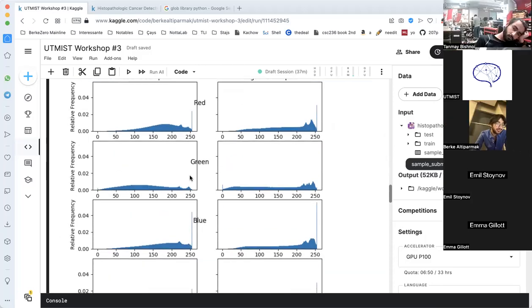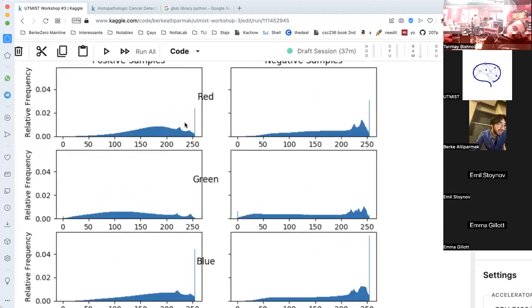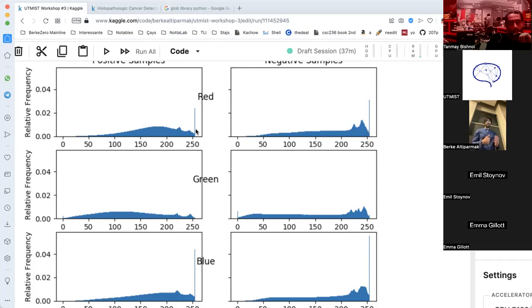What are the spikes at the end of the graph? As you can see, the distribution of the red channel values changes from 0 to 255, and it's rather a smooth distribution. But at the end, we see many images have the full brightness of red. What that means is that the white color is not actually a color by itself. The white color occurs when you have the maximum output by red, green, and blue.